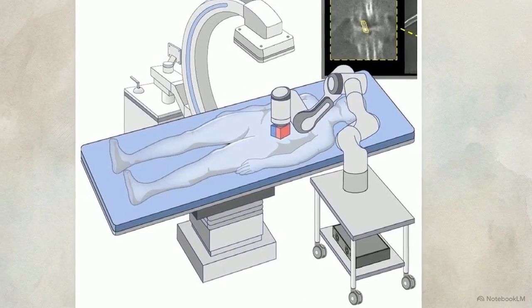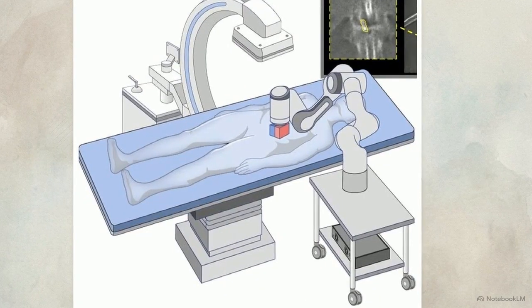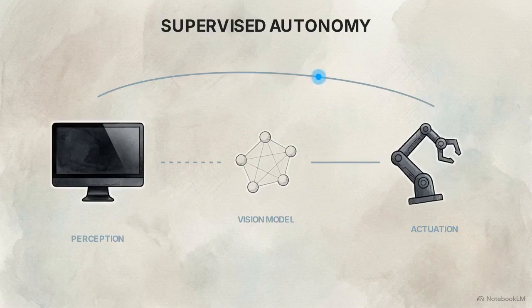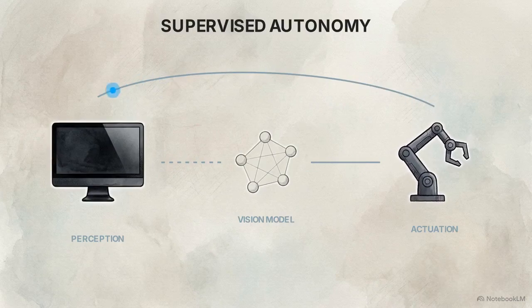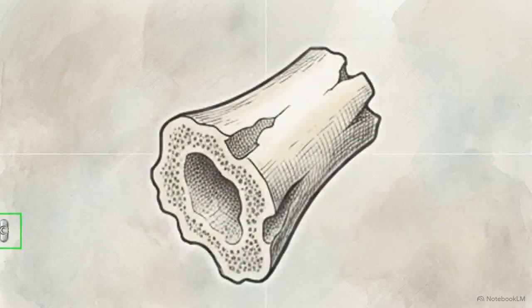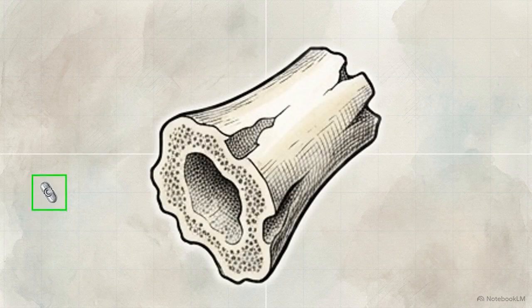The external setup relies on a 7-degree of freedom robotic arm wielding a rotating permanent magnet positioned directly over the patient. The trained computer vision model acts as a continuous visual feedback loop, translating the live X-ray perception into sub-millimeter robotic deployment. However, dynamic locomotion under dense bone will cause dropped frames and complete visual occlusions. Signal loss is inevitable. To maintain tracking, the system deploys software redundancies, specifically an adaptive Kalman filter.